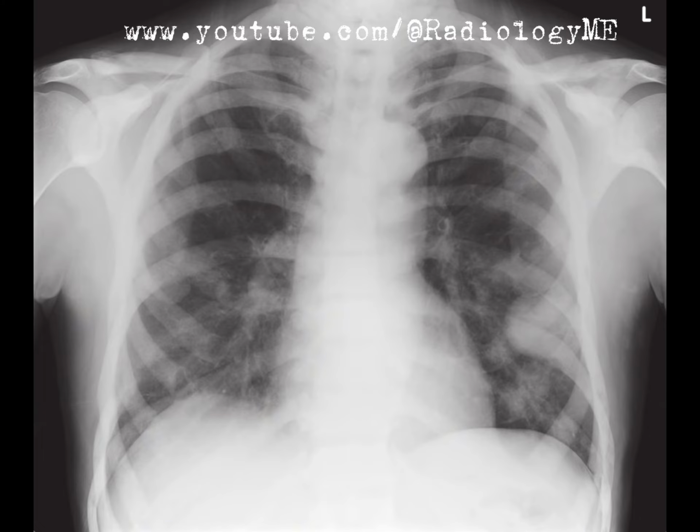Now, when I see this combination, diffuse bony sclerosis and multiple pulmonary nodules, the first thing that comes to my mind is metastatic disease. In a male patient, I would strongly consider metastatic prostate cancer. Prostate cancer is well known for causing osteoblastic or sclerotic metastases, and it's a classic presentation in men. The diffuse bony involvement we're seeing here is very characteristic. Although prostate cancer metastasizes to the bones quite frequently, pulmonary metastases are less common but can coexist, which is what we could be seeing in the lungs.